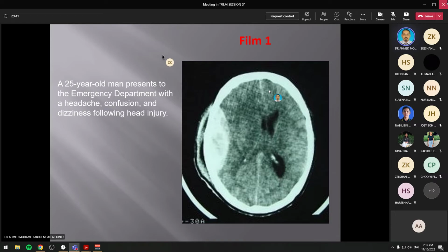Number 2, the type of the lesion. So like this one, right parieto-occipital epidural bleed. I say right, the region parieto-occipital, the type epidural bleed. That is the location and the diagnosis. If it is a subdural bleed, I can add the phase.